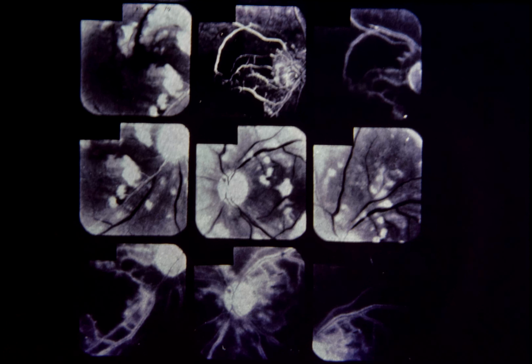Slide 79. Lupus erythematosus with hypertensive retinopathy. This 24-year-old white female with systemic lupus erythematosus complained of poor vision in both eyes. Acuity was 20/200 OU. Both fundi showed multiple cotton wool spots at the posterior pole and marked retinal non-perfusion throughout the fundus. Upper left, red-free photograph shows multiple cotton wool spots in right macula.